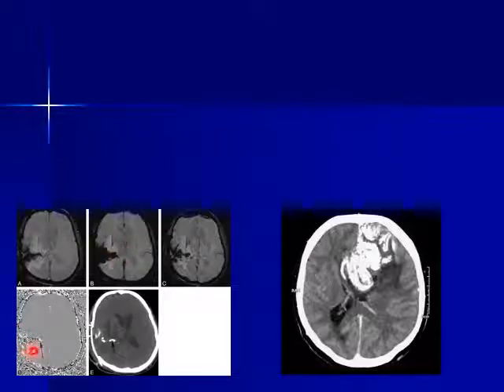But in the phase image, the calcification here is white or black like this. I'm not sure the image is that heterogeneous, but it appears black here, while the internal cerebral veins appear bright. Actually, I can explain this phenomenon much better in other cases, because I think there's some confusion here regarding the system. Sorry for this inconvenience.